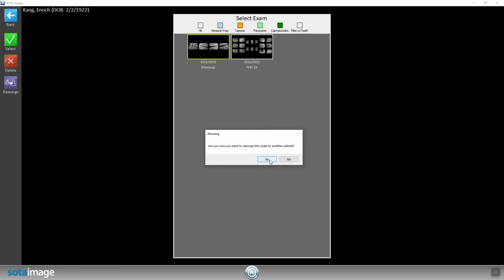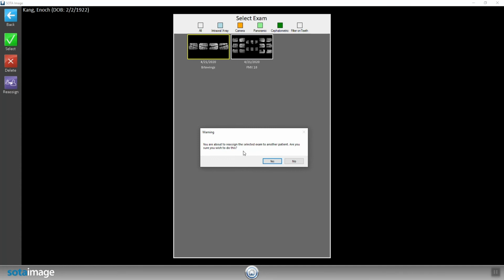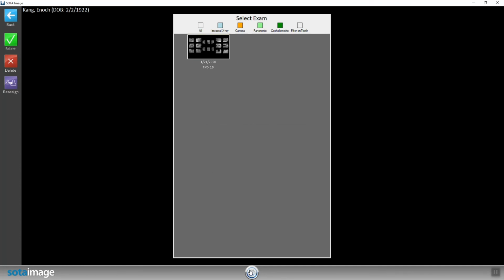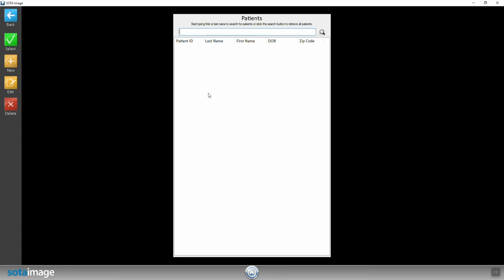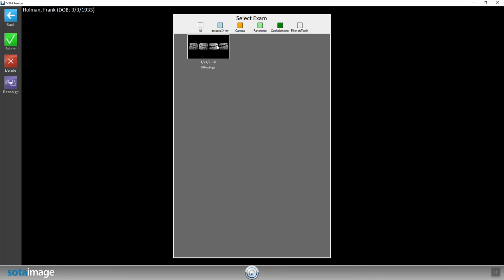Yes, I'm sure. I'll search for the correct patient name. Double click. Are you sure you want to do this? Yes. And then I'll go back home, search for that patient name, view his exam, and there's that bite wing correctly assigned to Frank.